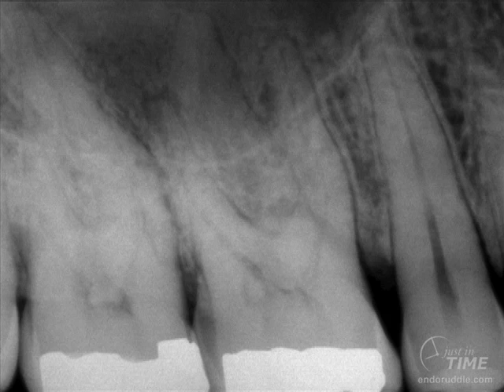All normal anatomy. And in this maxillary first molar, you can see that there is not a lot of pulp chamber left. The roof has almost approached the floor, and so it speaks to careful access, because we're not going to fall into this pulp chamber. We're going to have to be very careful that we don't blow through the chamber and start working unintentionally on the pulpal floor. But notice the entry angles of these canals as they move into the pulp chamber. Especially begin to appreciate the coronal 3 to 5 millimeters of that MB system and how awkwardly and abruptly the canal turns distally to enter into the pulp chamber. This really speaks about careful access, removing triangles of dentin, etc., etc.